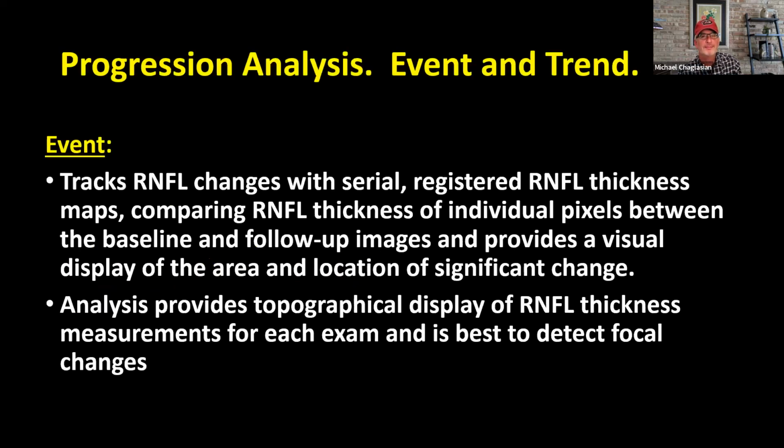Event and trend. So these are two terms, they're not printed anywhere in the reports. You wouldn't really know these terms. They just describe two different approaches to looking at progressive change with both visual fields and OCT on our glaucoma patients. An event is a type of analysis where it's more of a point-by-point change in an area or on a visual field test location between two tests or serially over several tests. And it's more localized, if you will.